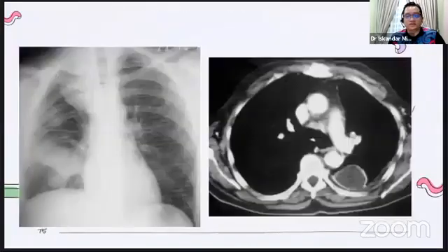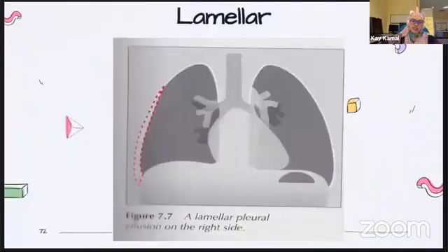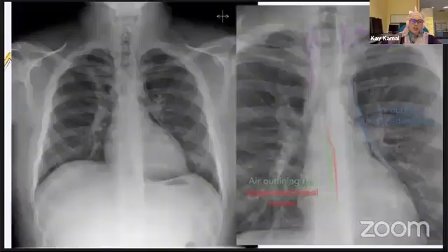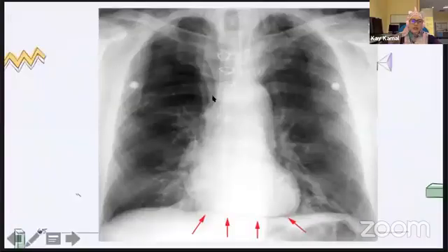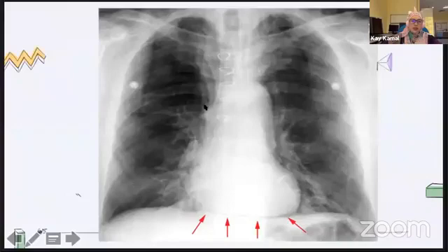Thank you in advance. Okay, this one is actually you missed it because I talked about it in the last session. So a wider mediastinum, we will take it at this level. You see my arrow? You will take it at about this level, at the aortic knob level. I usually take 9 to 10, because sometimes you have a PA, sometimes you have an AP, and in a good inspiratory X-ray, 8.